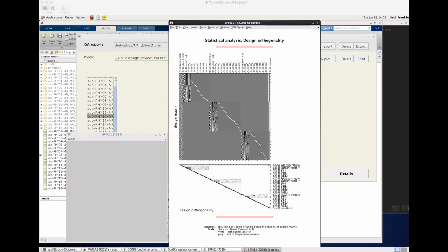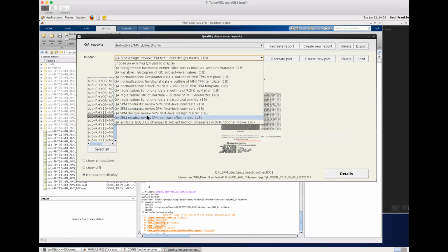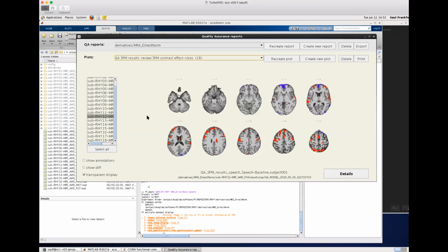Can you show that plot then? Yeah, the one that I stopped you from showing. Just go back to this for a second. To some degree, you can look at where task-related motion is in this plot. If you see anything that looks like motion effects, then probably you have task-related motion, and if you don't, you probably don't. But it might be good to have additional plots that quantify the level of task-related motion effects that you have. So in this case, it doesn't look that bad.